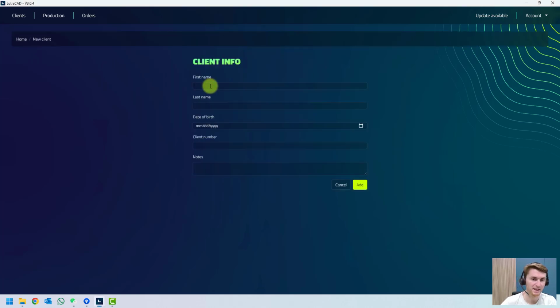We can fill in a name, first name, last name, birth date and client number, and on these 4 terms you can also find your customer back. Nothing is mandatory. If you only want to use a client number or last name, it's up to you.